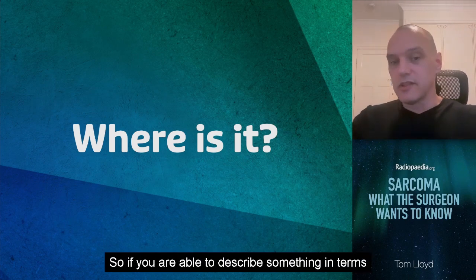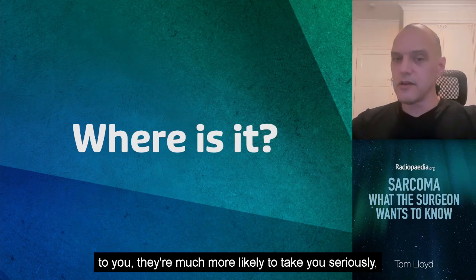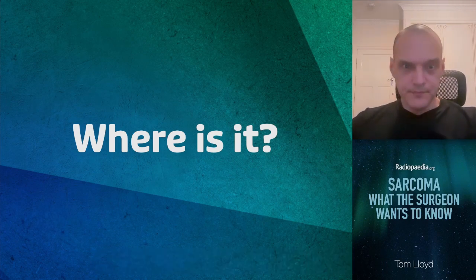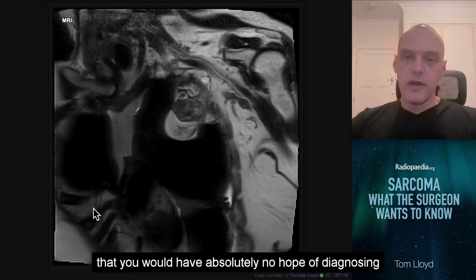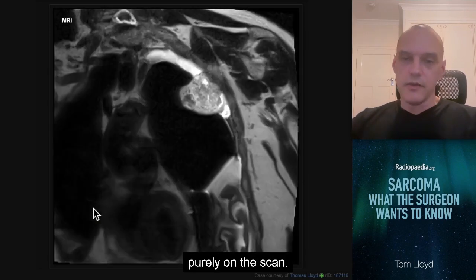So if you're able to describe something in terms of its precise anatomy, they're much more likely to listen to you, they're much more likely to take you seriously, and you're much more likely to be making an important contribution to the patient. So I'm going to show you a couple of cases that illustrate this point. So this is a case of a myxofibrosarcoma of the chest wall that you would have absolutely no hope of diagnosing purely on the scan.